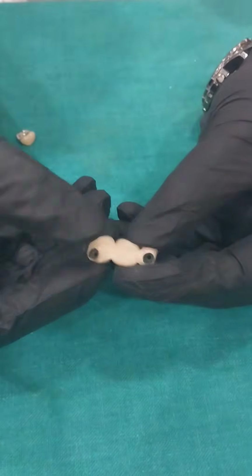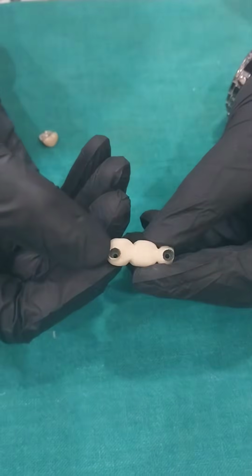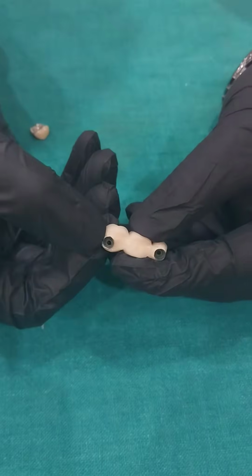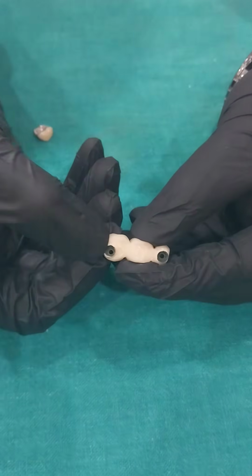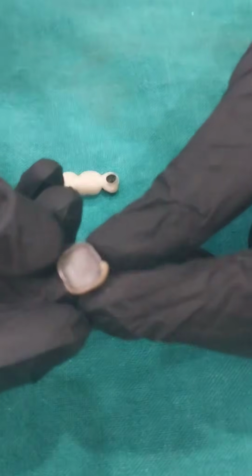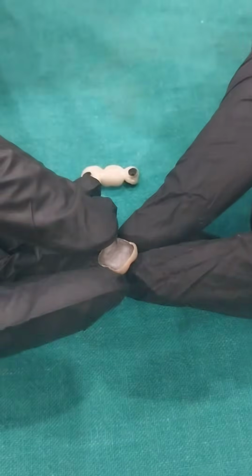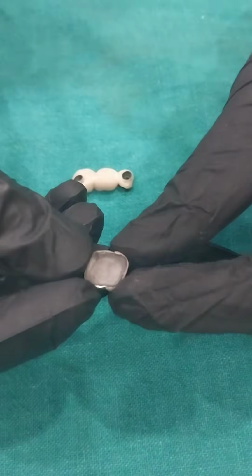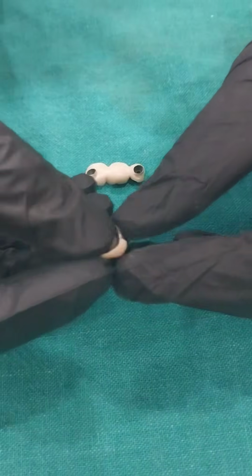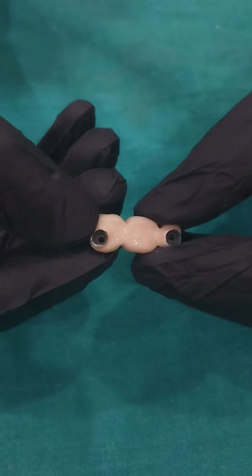Now if you look at the internal surface of the prosthesis, it is very dark and rough. I'm just talking in layman terms so that every dentist can understand. It is very dark and rough. It looks like a castable PFM. And if you look at this good lab work, the internal surface is very fine and smooth. This is your actual DMLS, which is made by laser sintering. You can make out the surface here is very smooth and the surface inside this one is very rough, which looks like castable lab work.